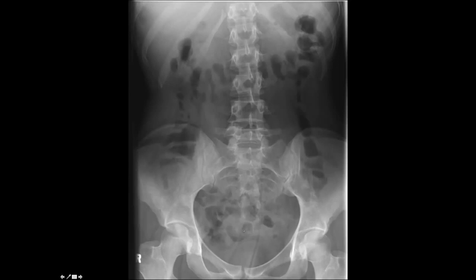That's very nice. You say it looks like large bowel. What is it about those gas appearances, apart from being peripheral, that makes it look like large bowel? Yeah, there are certain other things like location, so it's peripheral. Then usually large bowel contains gas, which is not the same for small bowel. In small bowel we usually don't see much gas. And then there is the presence or absence of the markings. In large bowel we see haustra, which are incomplete, widely placed lines like these ones. So these are haustra, one here, one there, and here.